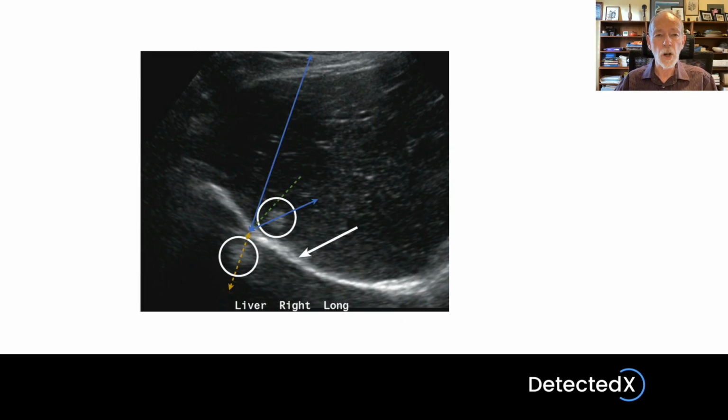So let's look at the geometry. So again, the blue line represents the ultrasound pulse, travels down that pathway, bounces off the diaphragm, back into the liver, strikes that echogenic mass, echoes from that mass, travel back down to the diaphragm and back up to the probe. The machine thinks that the ultrasound has travelled on down the line I've shown in yellow, and therefore that's where the mirror image is displayed.